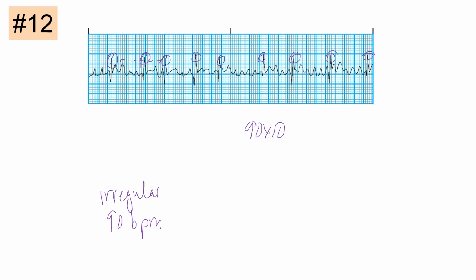And what is the rhythm? So we do have a QRS, and is there a P wave? Definitely no P wave. There's just some squiggly lines. They don't really look like a pattern like the one we just saw with the sawtooth one. So this is atrial fibrillation. These are just squiggly, you can't really tell, can't count them. Irregular rhythm, 90 beats per minute, atrial fib.